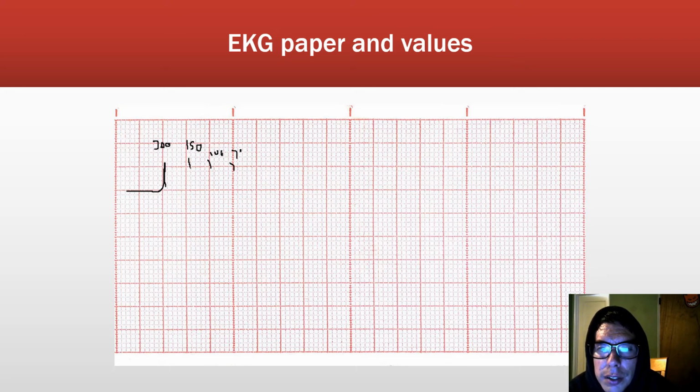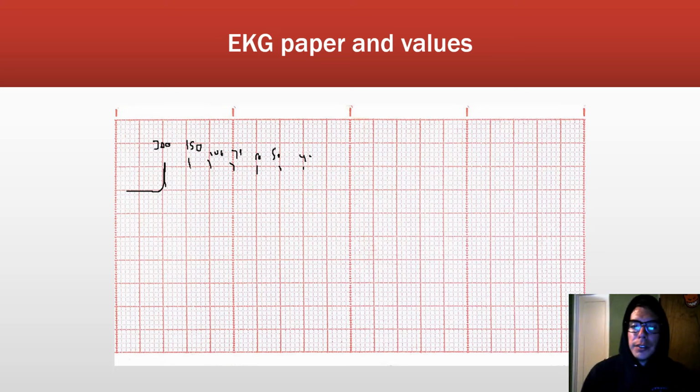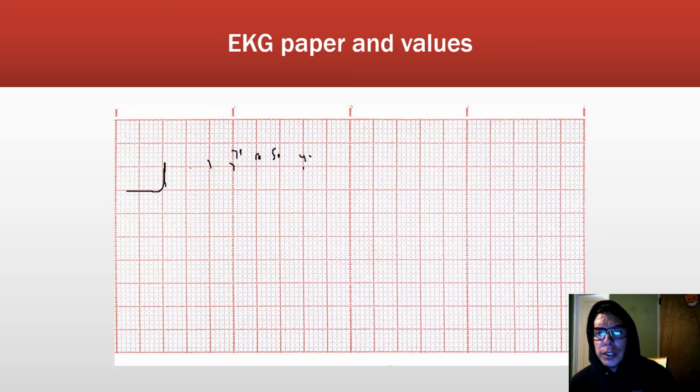75, 60, 50, 40, so on, like that. So you can count that, but I think we talked about that a little bit later in here. I just wanted to quickly show you that.